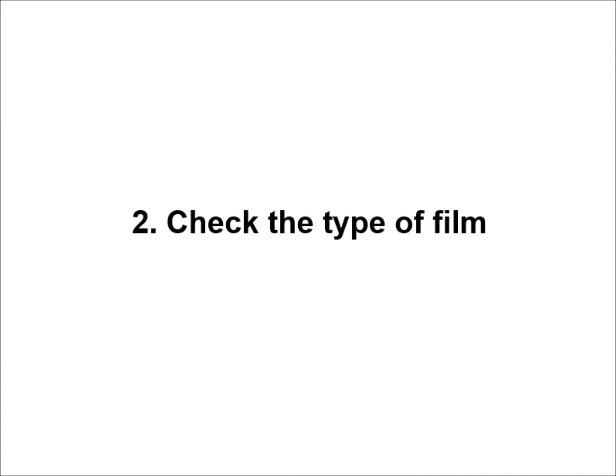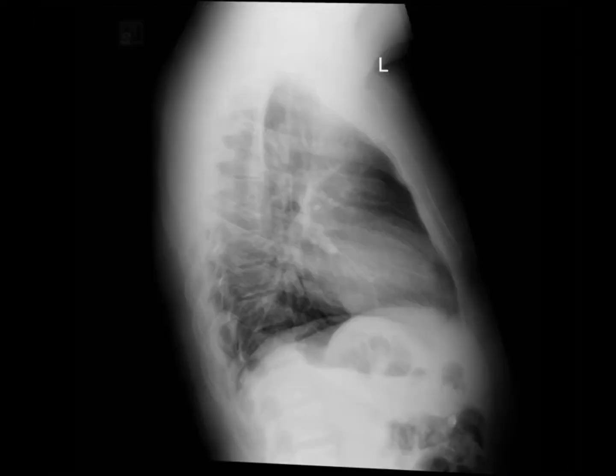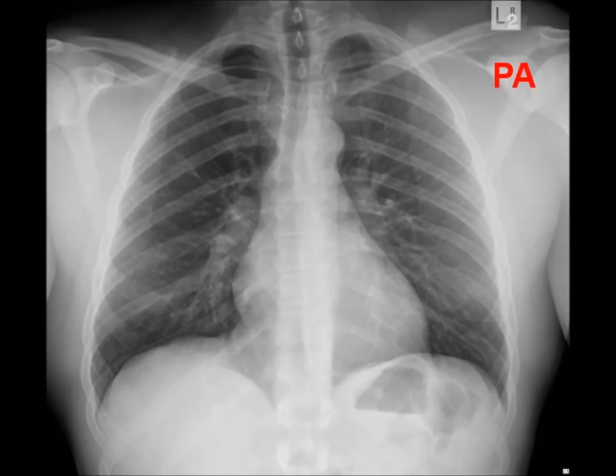Often you will be told the type of film, but if not, there are clues you can look for. First, you want to know from which direction the X-ray was taken, PA, AP, or lateral. While a lateral film is easy to spot, differentiating between an AP and a PA requires a bit of Sherlock Holmes clue hunting. Look at the clavicles and scapular edges on this PA film.